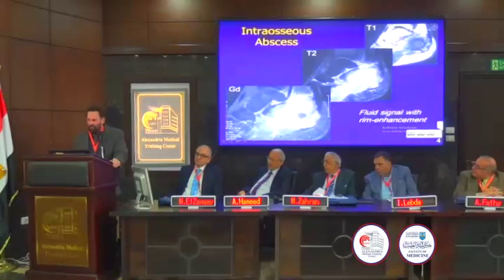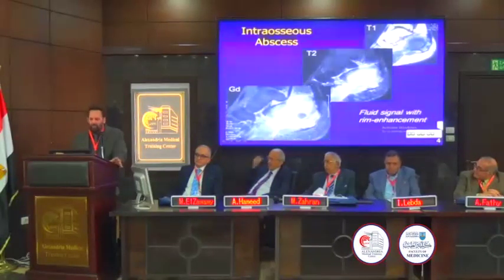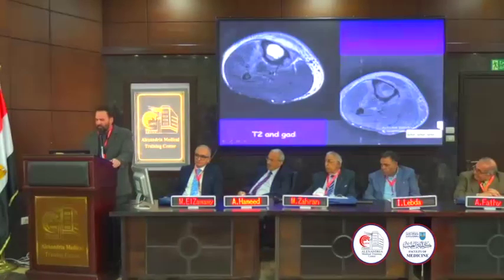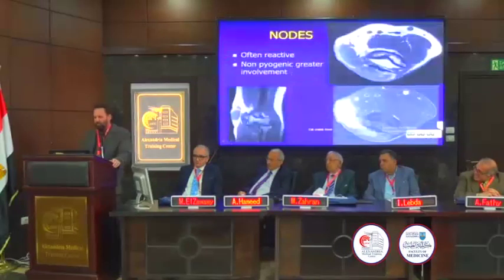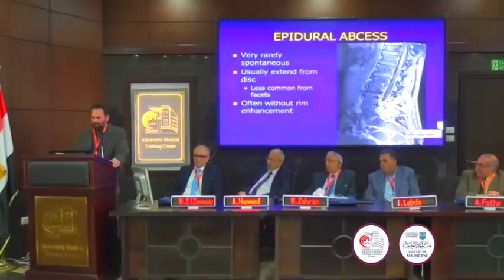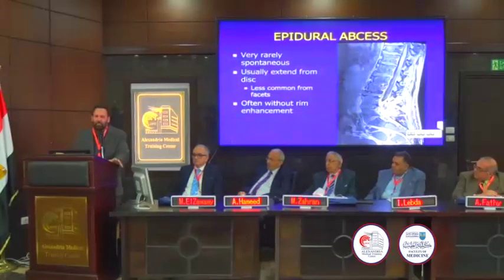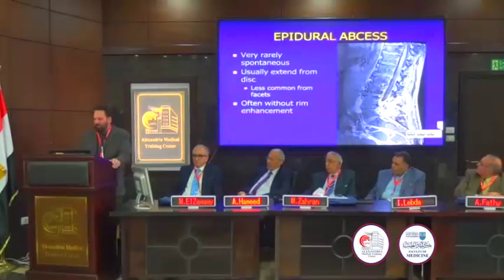Intramedullary abscess. Not Brody's, because there's edema around it, which tells you it's a relatively acute abscess. Brody's are by definition non-acute abscesses. A subperiosteal abscess, typically this would be seen in children. An intramedullary abscess, rim enhancement, also typically in children. And epidural abscesses tend to have less rim enhancement. They tend to look somewhat more phlegmonous than abscesses, but at surgery they're still abscesses.